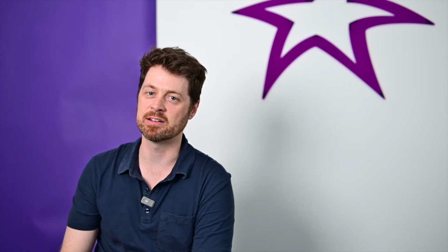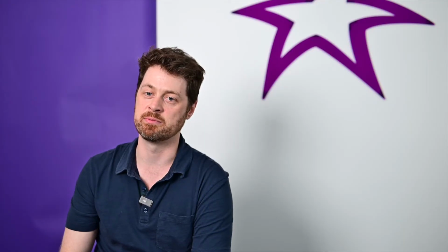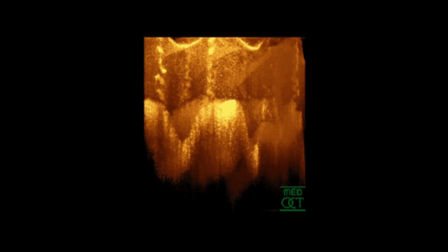This setup is analogous to a full-field OCT, in which interference is simultaneously measured over a 2D area while moving a reference mirror in order to generate a 3D volumetric image. The 3D structure of the sample can be inferred by the interference observed as the reference mirror is moved.